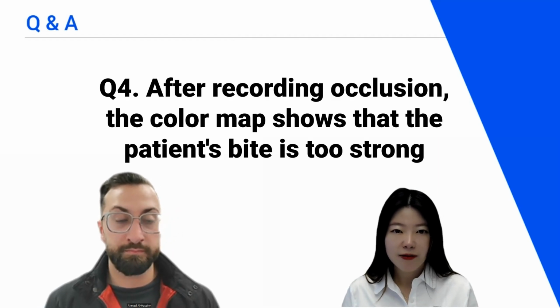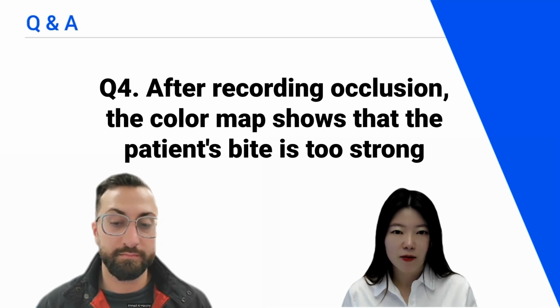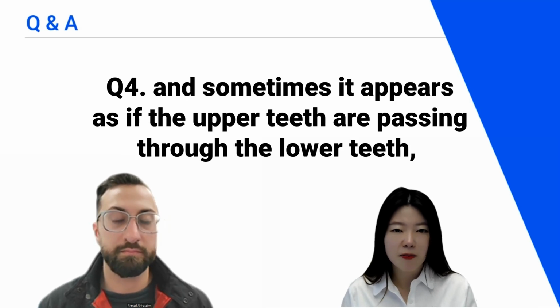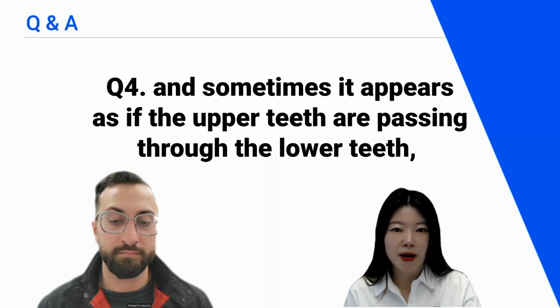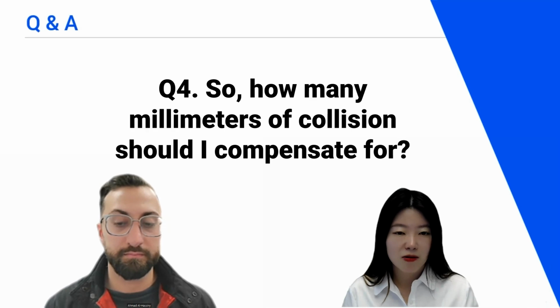Okay, last question is quite long. So yeah, question number 4. After recording occlusion, the color map shows that the patient has a bite which is too strong, and sometimes it appears as if the upper teeth are passing through the lower teeth, which would not really happen in reality. So how many millimeters of collision should I compensate for?